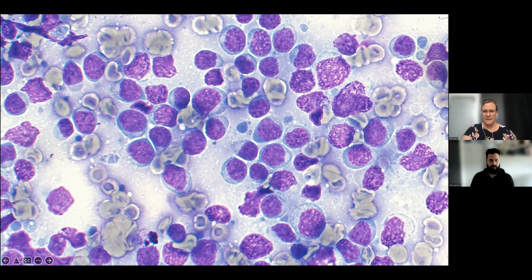And so what we're seeing here is we have to ignore just the blood in here. It's stained a little bit weird, so just ignore these green red blood cells in the background. But we've got this population of round cells here. So of course, when we're looking at cytology, we want to try to categorize populations as epithelial, mesenchymal, or round when we're thinking that we're dealing with a neoplastic population. And here we've got a population of round cells.